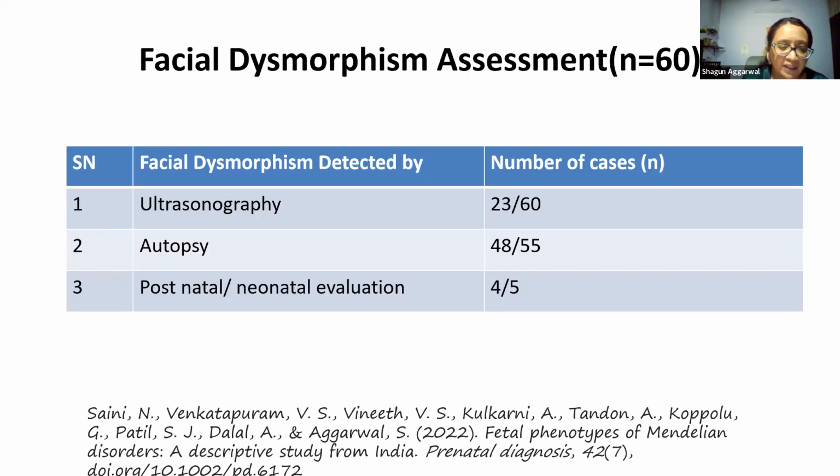Yeah. Thank you, Neelam. So basically, facial dysmorphism is mostly a very subtle finding, but if we start looking more carefully, often we do find some fetuses with these kinds of abnormal facial profiles. Some may be very subtle, sometimes it may be striking also, like in cases with craniosynostosis and all.